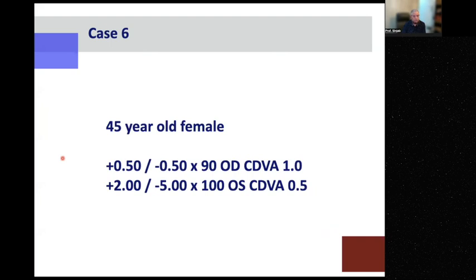Okay, now, what is suspicious about this case? Very good, Hamda. Advise not to rub the eye and reevaluate. Very good. For the previous, of course. Yes, Abdulaziz, high anisometropia here. Not reaching 20/20. Very good. Amblyopia left eye. Maybe, but a good remark. What else?